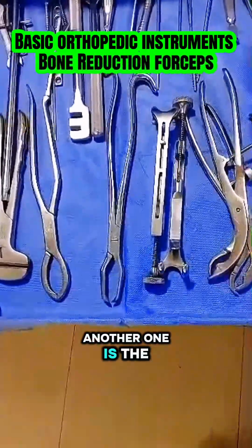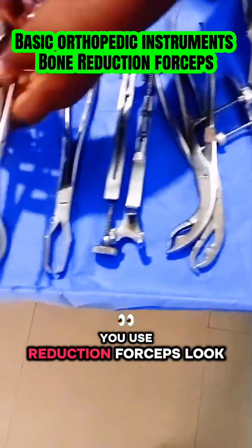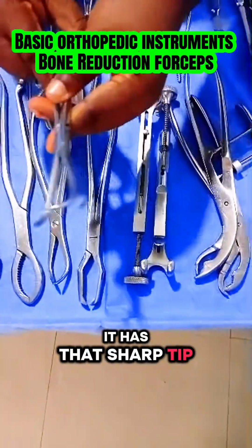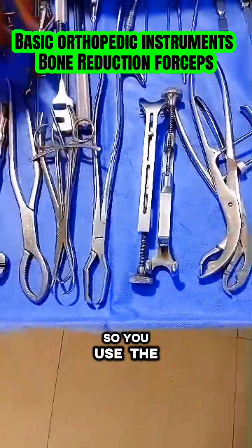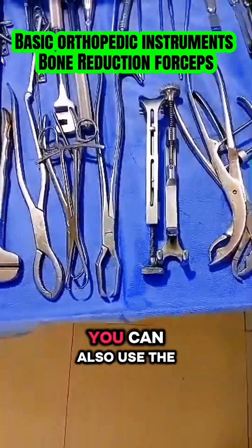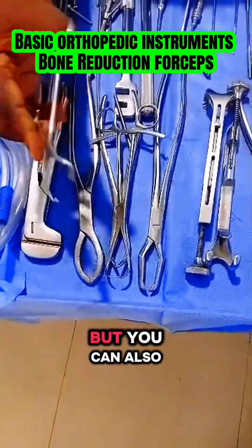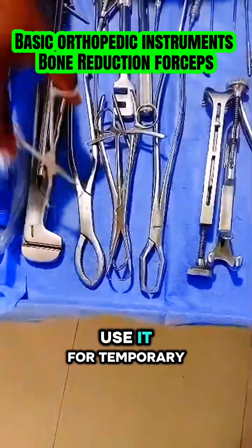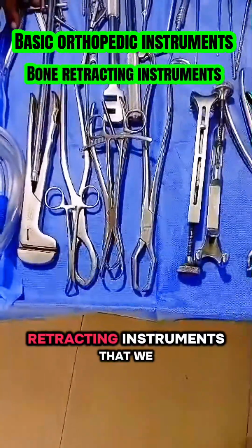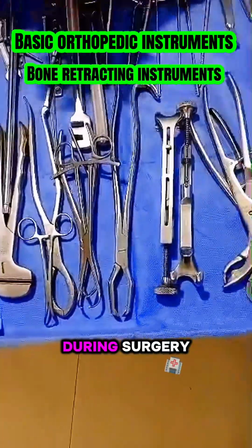Another one is the reduction forceps. When you want to reduce the bone, you use reduction forceps. Look at it. It has that sharp tip. So it aligns and stabilizes fractured bone. You can also use the towel clips. We use them to secure drapes, but you can also use them for temporary bone holding. So that's it. Then you have retracting instruments that we use to expose bone during surgery.